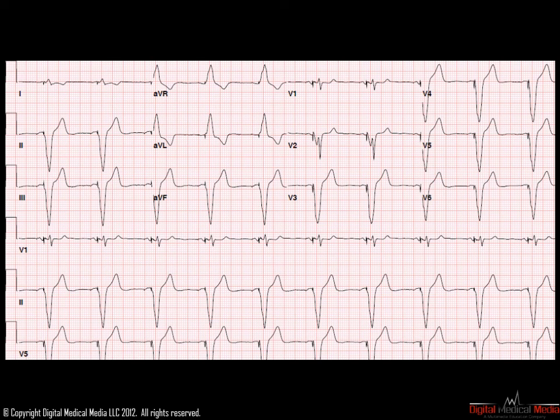It is important to note that the shape of the paced P wave has nothing to do with the shape of a P wave from the sinus node. That is because the wire which is driving the P wave in the atrium is not generally placed near the sinus node complex. Therefore, it is unimportant what the shape of the P wave is when we are looking at paced rhythms.